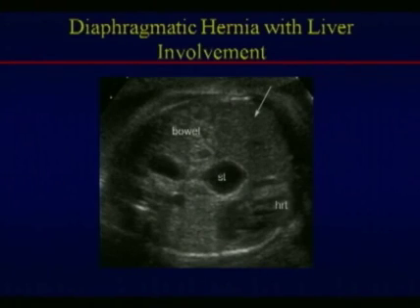One of the clues of looking at liver involvement in the thorax, you can also use on transverse views, as in this case, and a good clue that was suggested to me and probably to some of you in prior lectures by Ruth Goldstein was the position of the stomach. If there's no liver involved, then oftentimes the stomach is anterior, right up next to the anterior chest wall.